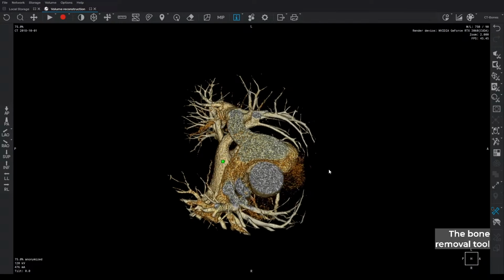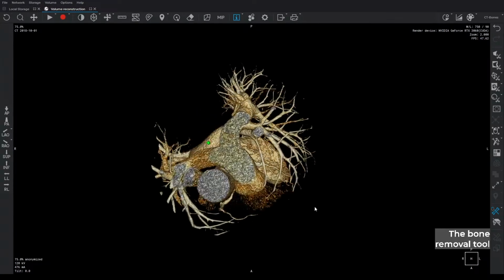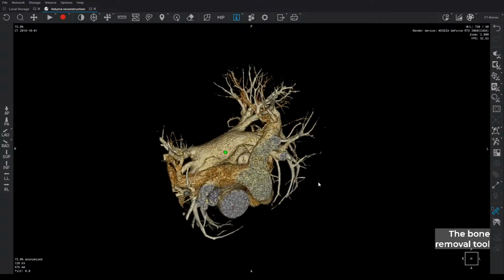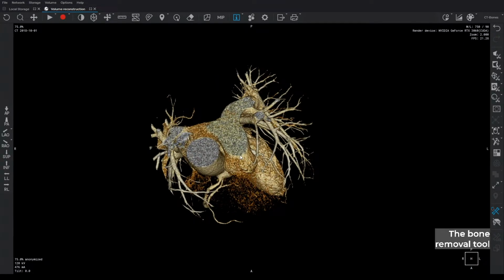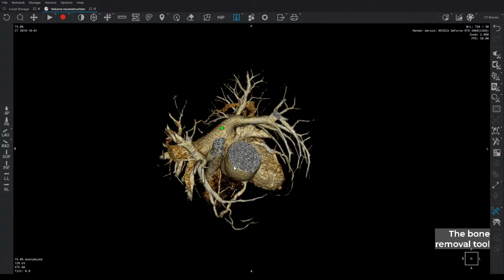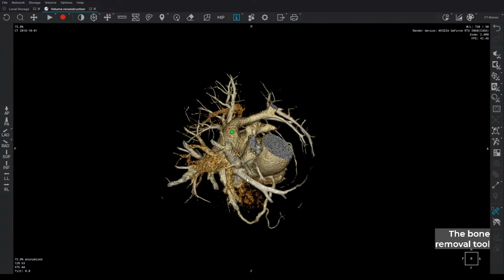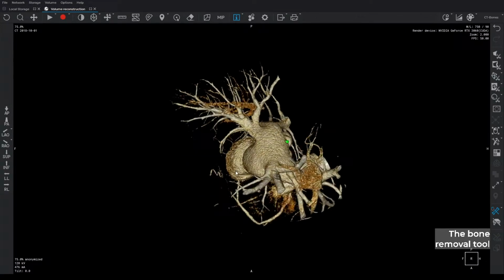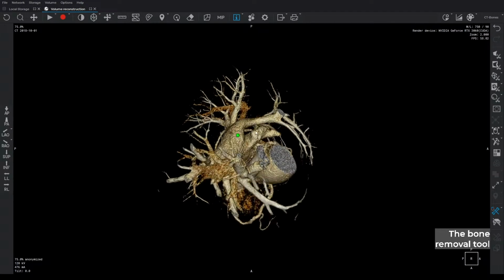Now we click on the bones and we can see that they have been removed. As well you can remove some other parts which you don't need; it removes all those parts which are not connected with the marked one. Do you see the result?